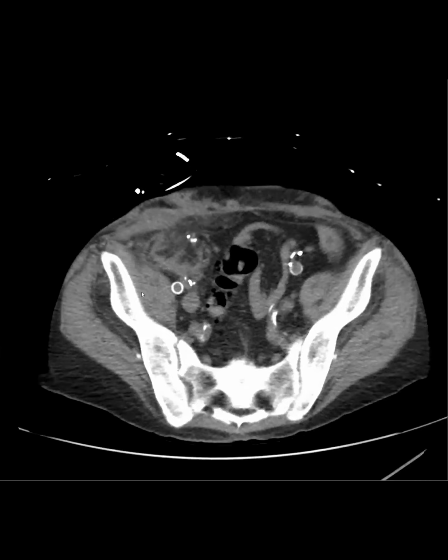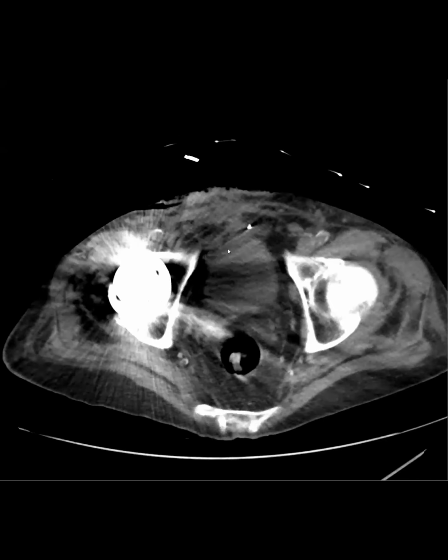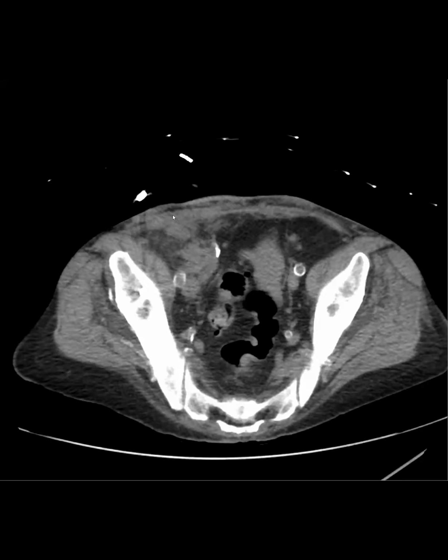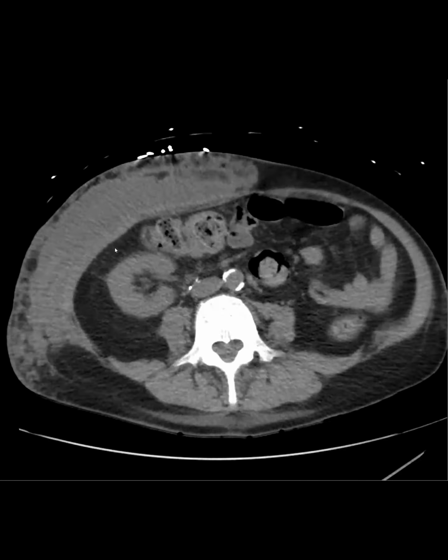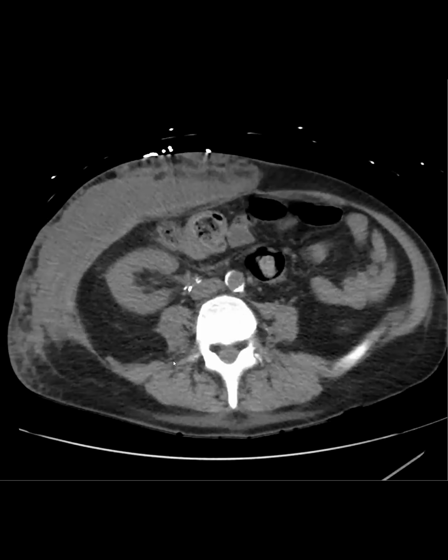And this is a pancreas transplant that was done a very long time ago, and it was connected to the bladder. And you can see that there's irregularity of the bladder and the fluid. So anyway, basically they drained this collection. We tested it for amylase and lipase, and it was very elevated.